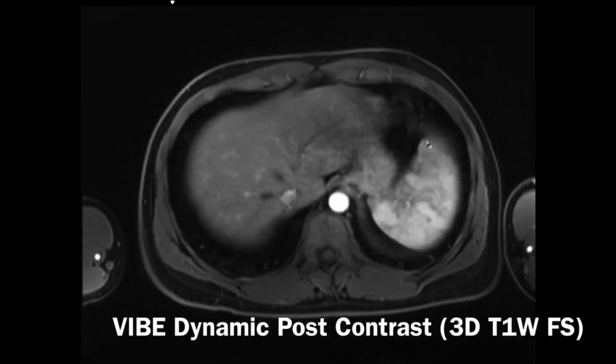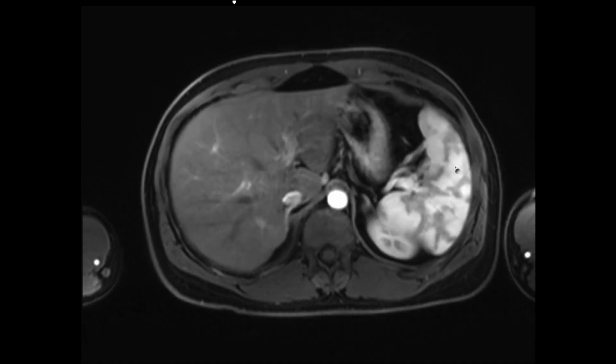Then we have our post-contrast images, so we have our dynamic arterial phase images. And so here you can see that the contrast is now on board. We've given gadolinium.